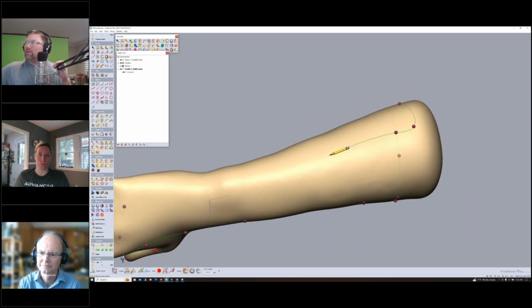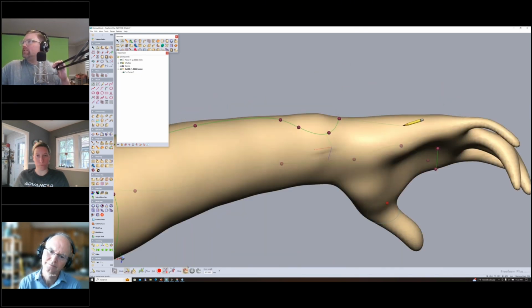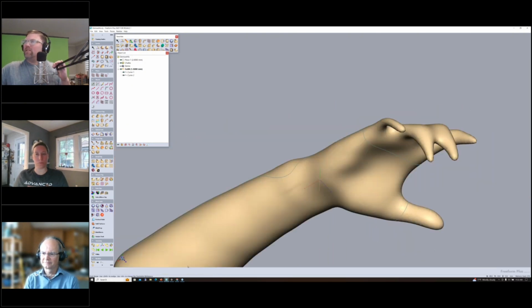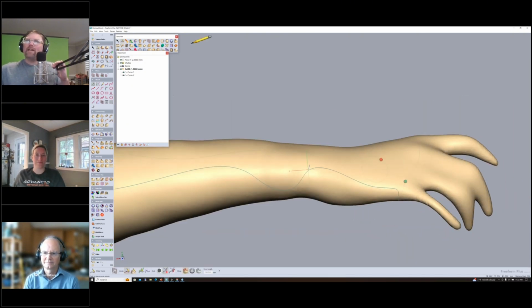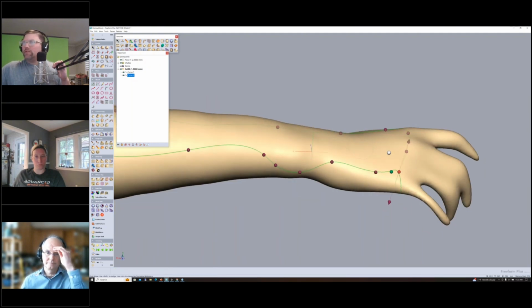So we're going to come here. We're just placing this. We're going to also relieve for that styloid process here. So I'm going to finish up these trim lines. And we've got some trim lines. So these aren't perfect, and you can go back and change them if you want to get some of the wobblies out. And the fewer dots you have, the better off you're going to be, and you won't have these wobbly looking dots there. So let's just call that good.